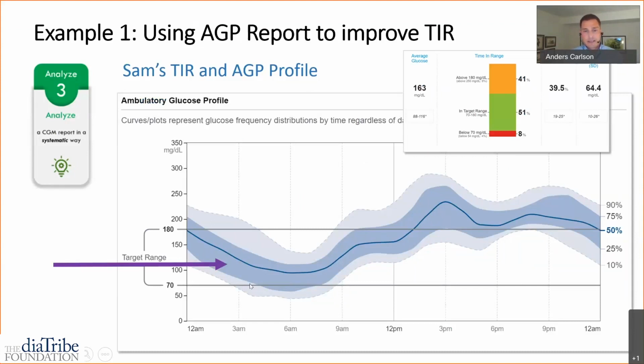But you can see from his AGP, immediately your eye is drawn to the fact that his hypoglycemia is almost exclusively in the overnight and early AM hours, kind of the 3 to 6:30, 7 a.m. range. And then he's high after breakfast, lunch, and dinner later in the day. So those observations that his wife was having, that he was a little sleepy, were likely episodic hypoglycemia.